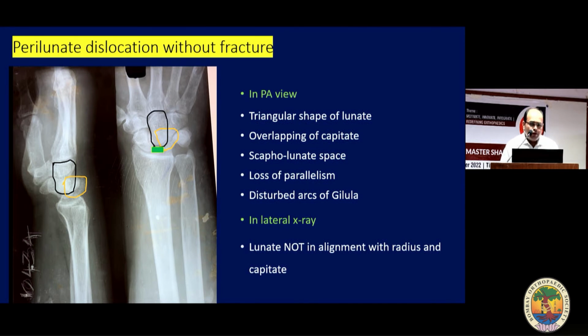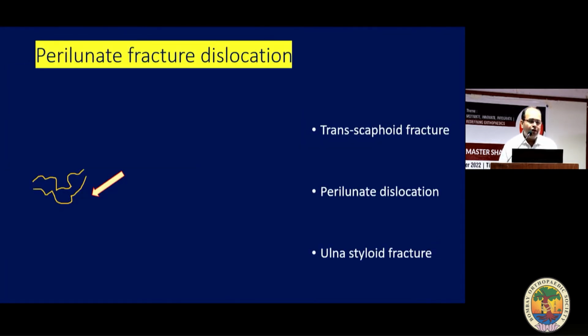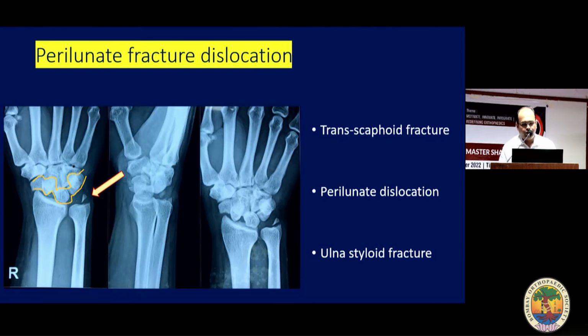When we want to diagnose a perilunate dislocation with fracture, we are talking about a radial styloid fracture, or a scaphoid fracture and capitate fracture, or an ulnar styloid fracture, along which the force is transmitted. It's the Mayfield concept, whose theoretical discussion I would not like to go into, but here what we see is a disturbed arc of Gilula, and we also see an ulnar styloid fracture.